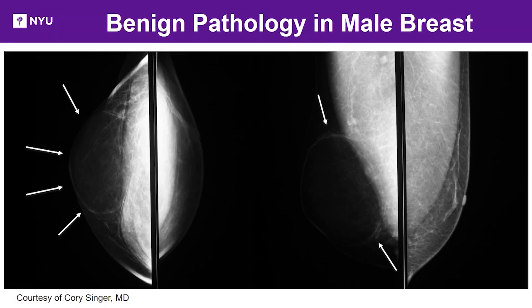And just for a companion case, to show you another male breast, what I've tried to outline is this predominantly lucent fatty mass. You can see there's a capsule around the palpable abnormality. Here I'm outlining the MLO view, and this is a large lipoma in a male breast.